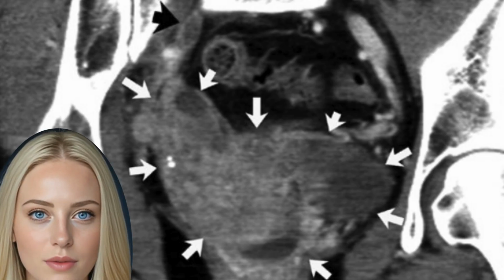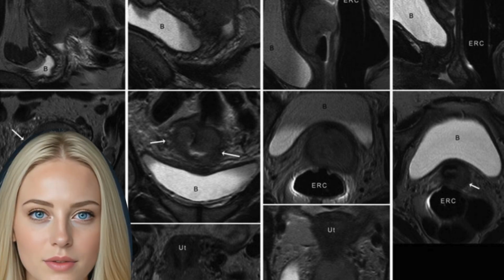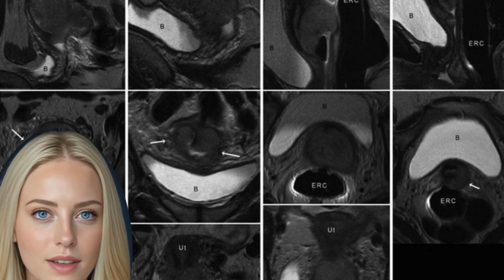There is a signal decrease on ADC map and a hypointense signal in early phase after application of contrast IV in T1WI with fat saturation compared to surrounding tissue. Best delineation will be reached 15 to 30s after contrast injection. In late phase, however, the tumor represents hyperintense compared to uterine myometrium. Dynamic contrast-enhanced sequences are therefore recommended.